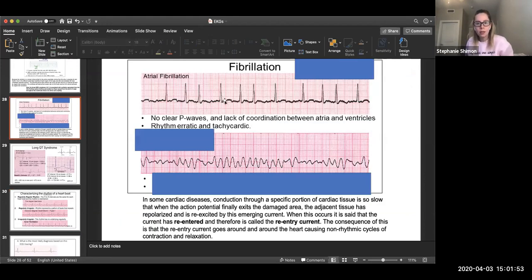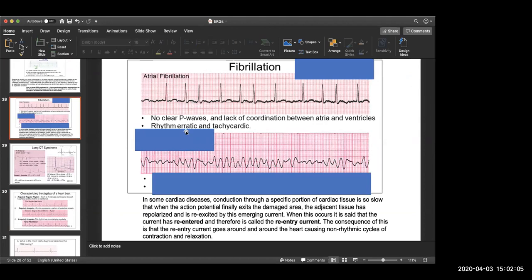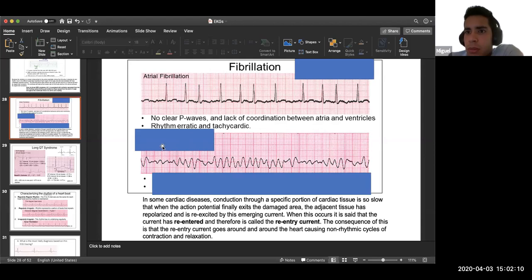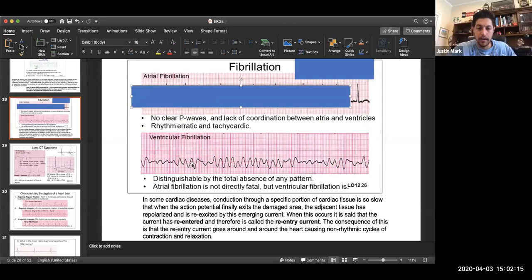I'm gonna tie it together with the heart blocks. Cool. Thanks. So yeah, when you don't see clear P waves, when you see this erratic activity here before the QRSs, we're talking about AFib. Okay, this is just pattern recognition. What is this rhythm right here? VFib. VTach or VFib, the better answer, right? Notice that there's no pattern here. These QRS complexes don't really look consistent all throughout. Right here, they're really tiny, then they get bigger again. It's just the ventricles going like this, basically.